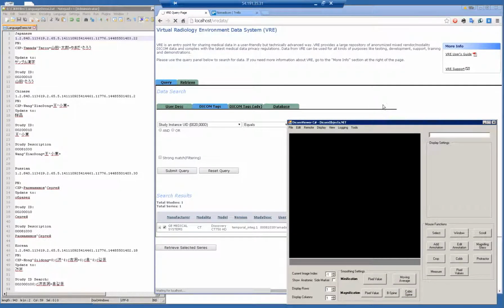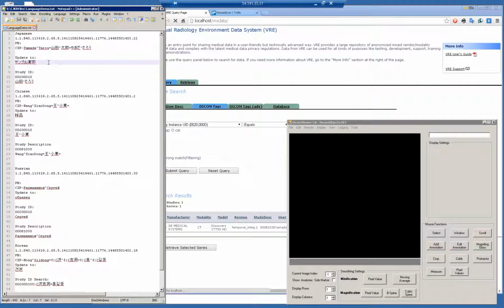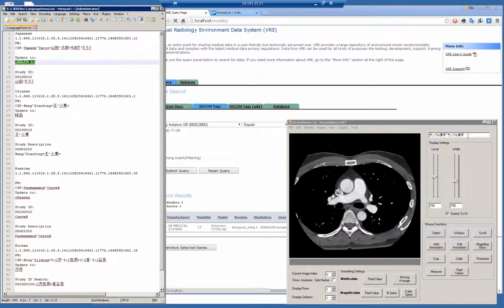Select it and send it directly to the SCP. And you'll see the updated DICOM header with the value here that I've highlighted in Notepad++. And you can see the values here, they match. I use them for the patient name and the last name and first name.